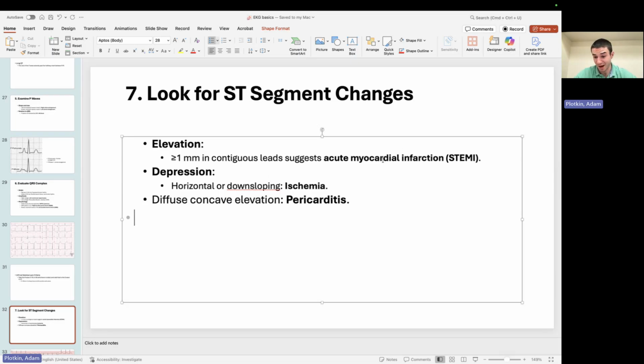These patients will have ischemia of the heart, and they will have elevation of their troponins, which are a sensitive marker that get released from dead cardiomyocytes. But the problem is they don't get released right away. Sometimes it takes a while. So oftentimes, if a patient comes in with chest pain, you don't just get one EKG and one set of troponins. You get serial EKGs and serial troponins, and you see how things change if you have a concern.